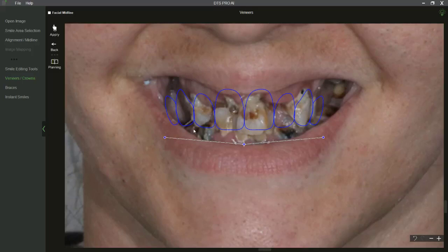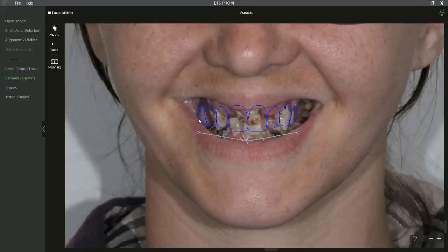And then canine tips needed to come up, we said. So I'm going to bow those cusp tips upward. And obviously I've widened out her smile too to the width of her nose. I could probably come in just a little bit to right there. And very quickly we now have a tooth set up.